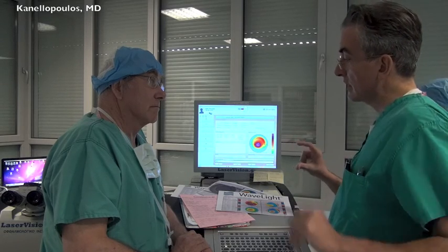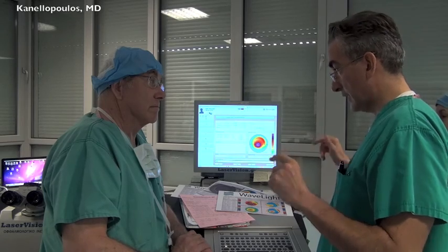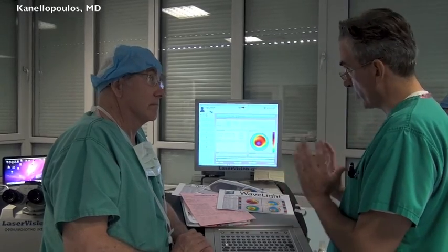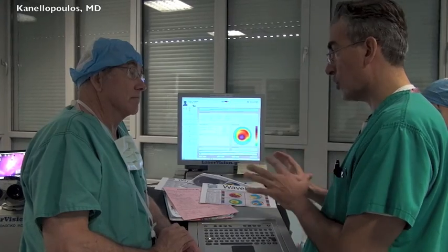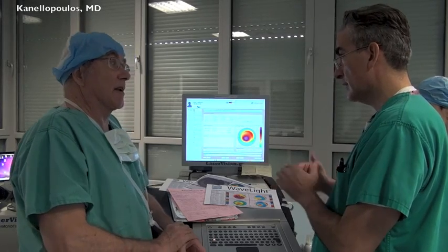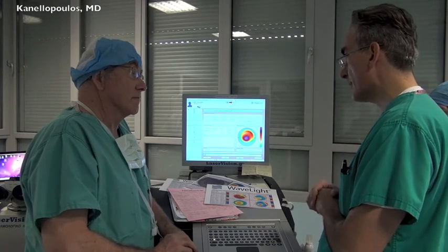So that tells us that the periphery, which is about 55 to 60 microns, gets more shots just because the laser uses the same algorithm as myopia for PTK, which is not the proper way to do this. And we know by experience, even treating a normal eye, if we just do PTK with this laser, it will induce a half-diopter of myopia, because you're thinning the periphery. We're thinning a little bit the periphery. It does a mild hyperopic correction.